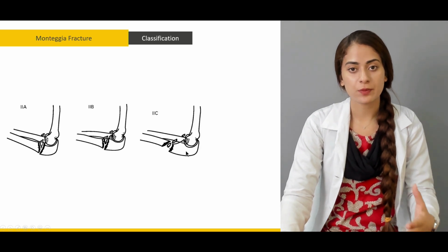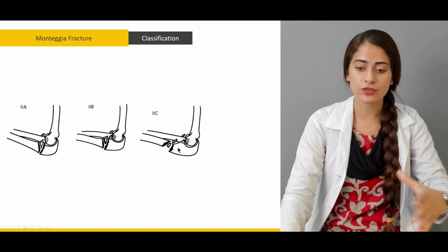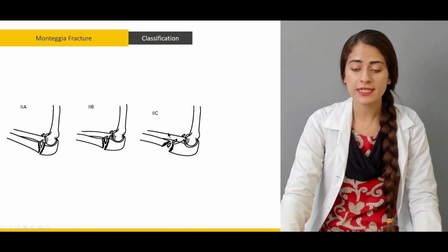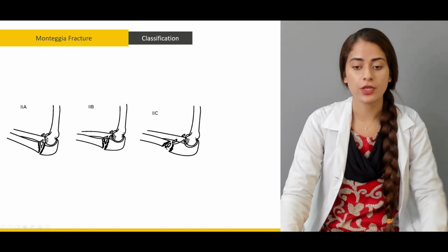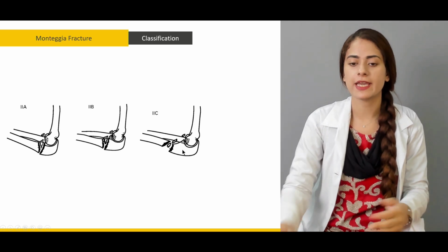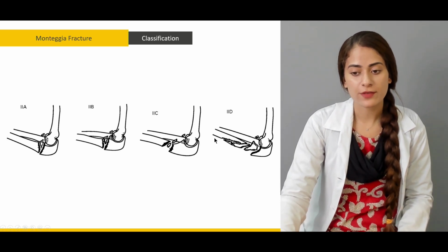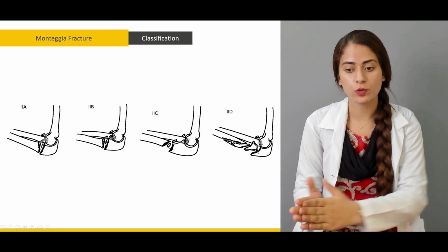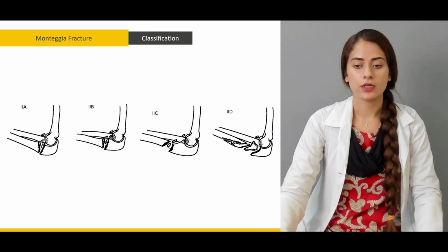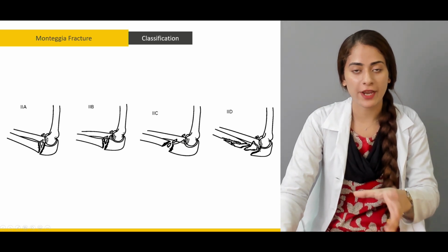And in type 2C, it has moved past. It has actually crossed the neck of the ulna and entered the shaft area. So this is how we differentiate between 2A, B, and C in Monteggia fractures. Again, this is moving away from the proximal portion, moving distally, and that's how we name it. And this is comminuted as well, but there are relatively bigger fragments of bone.